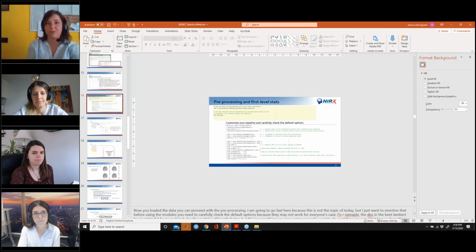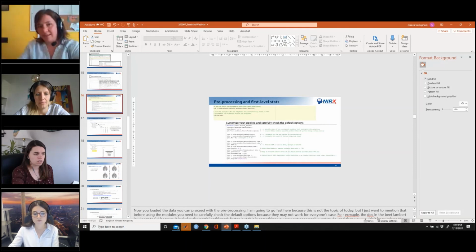Channel 1 HBO, channel 1 HBR, channel 2 HBR. So these are all statistical tests. Then the condition doesn't have anything to do with this. It is fit to the time series. And so the question, I think, was about whether the p-values returned by the NIRS toolbox actually take into account both channels, conditions, and hemoglobin. No, it takes into account channels and components, but not conditions.